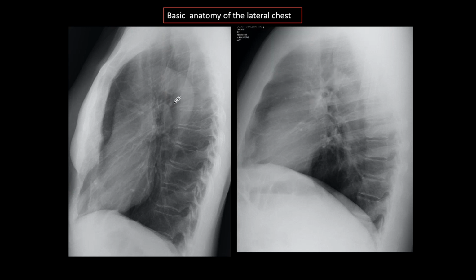of the chest films. And you see under the trachea the hilar region that we talked about in the previous webinar. As you remember, the normal anatomy: anterior to the trachea is the right hilum or the right pulmonary artery. Posterior to the trachea is the left hilum, or the left pulmonary artery.